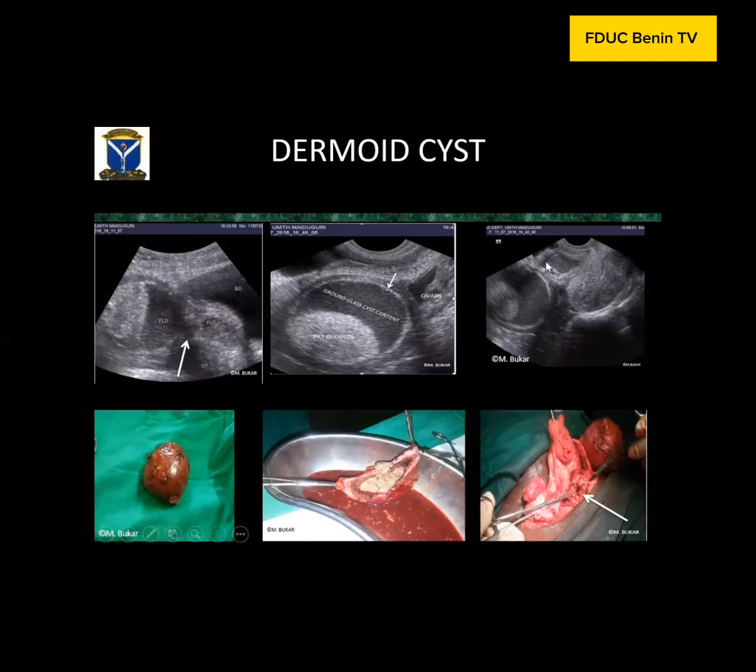Now look at this second dermoid, which we thought was the second dermoid, but at surgery we realized that it was a loculation of pus. We took the samples and sent for cytology, and it came out to be purulent. So if you have not followed these patients, as far as we are concerned, our report will be multilocular dermoid. So it's extremely important to follow up patients. Extremely important. You learn a great deal when you follow patients. Now, if you look at the contents of this cyst, it appears ground glass. So not all ground glass appearances are endometriomas.